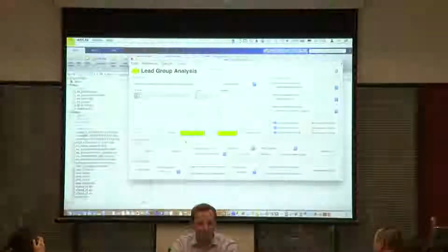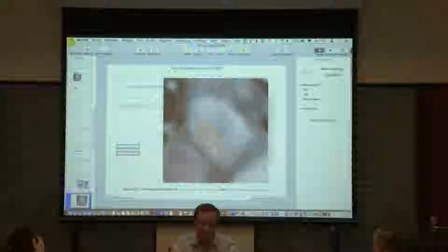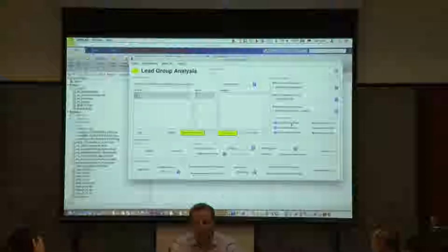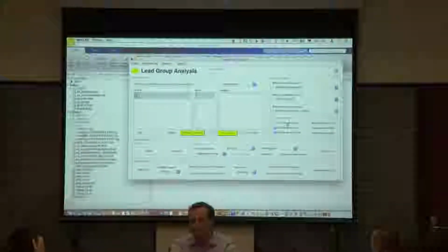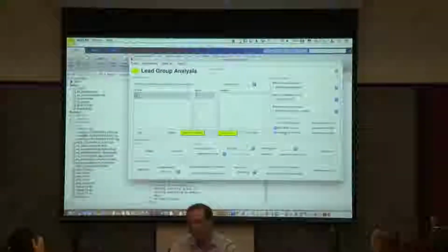That's fine. And then what's next? Okay, here we see active contacts are red. And this should also work in 2-dimensional view, which is apparently broken. In the 2-dimensional view, it can also be helpful to say, do we even want to show the passive contacts? Maybe we just want to show the active contacts, or only the passive contacts. Rather rare, but sometimes we just want to show the active contacts and highlight them or not, and then visualize it in 2D. Usually that should work.